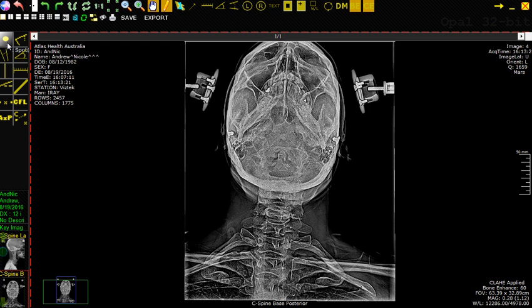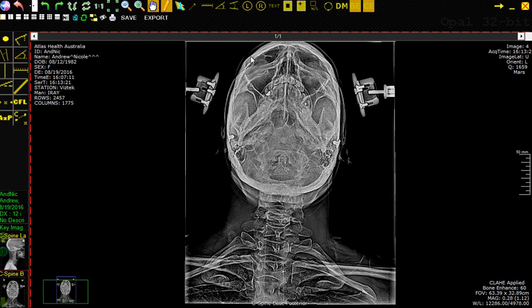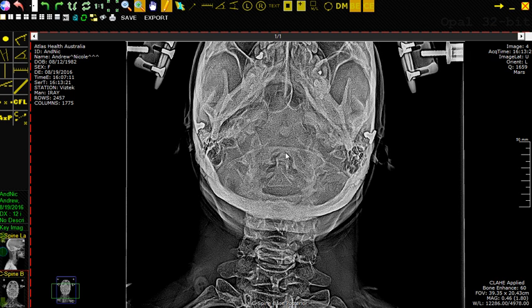There are a few points and a few things that I will show that we are trying to identify right here. If you can kind of make out a halo with the peg in the middle, that's what we're trying to see. The halo is looking top down on the first vertebra in the neck, and the peg that you see in the middle is where it sits on the second vertebra in the neck, and that's really what we're trying to identify. And there are a few points that we need to be able to identify in order to do the measurements, the analysis, and the annotations that we need to do as Blair chiropractors. So I'm going to use just the dot tool just to highlight these initial spots.